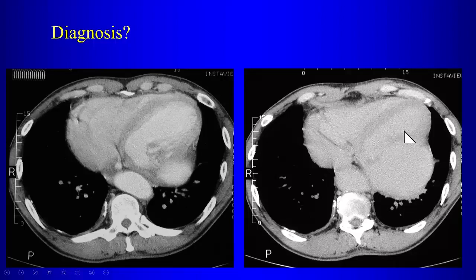Notice the myocardium. Here's the myocardium here, right? So a false aneurysm then represents a contained perforation of the myocardium as a complication of a myocardial infarct again. And this is contained by pericardium. So what's the treatment for this? No, probably the last thing you want to do. Surgery is the treatment, right? Because the complication here is rupture, right? Pericardium rupture, the patient will have a hemorrhage and will bleed to death. Okay, so the treatment for a false aneurysm is surgery, right? So you need to fix that false aneurysm.